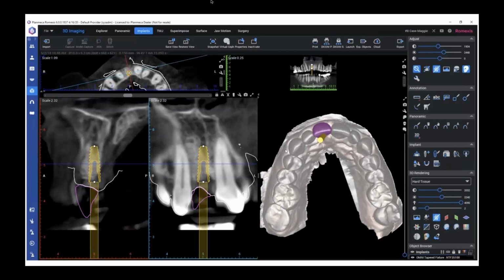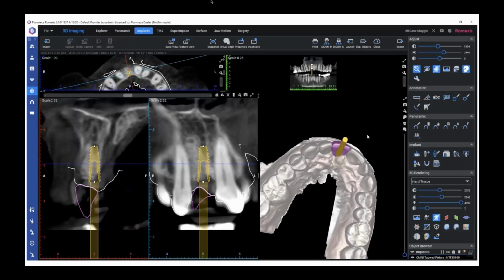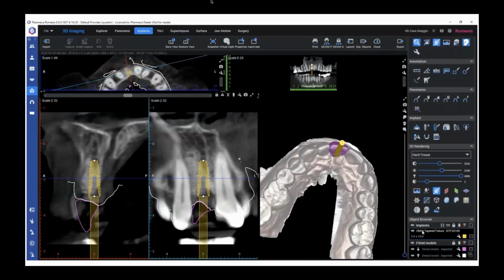And this is how I set up all of my plans. On the left side, I put the view in implant-centric view, meaning we have cross-sections using the implant itself as the long axis for the radiographs. So this is absolutely essential, in my opinion, to have it in that view. A lot of things that you can see on a cross-sectional view or a traditional two-dimensional view, you're kind of missing out. So implant-centric view obviously is very important.